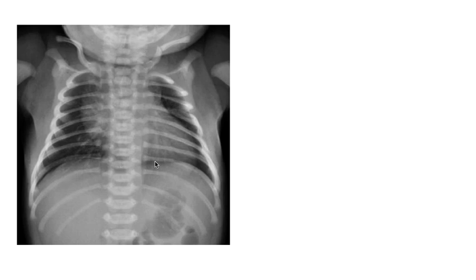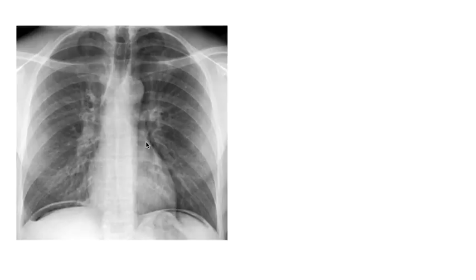What is abnormal in this X-ray is the bone fracture, right? So there is a left clavicular fracture. So we have to pay attention to the bone also, right? Similarly, look at this X-ray. What is abnormal in this X-ray? So the trachea is midline, lung fields appear to be okay, penetration is okay, there is no rotation. So what is abnormal?